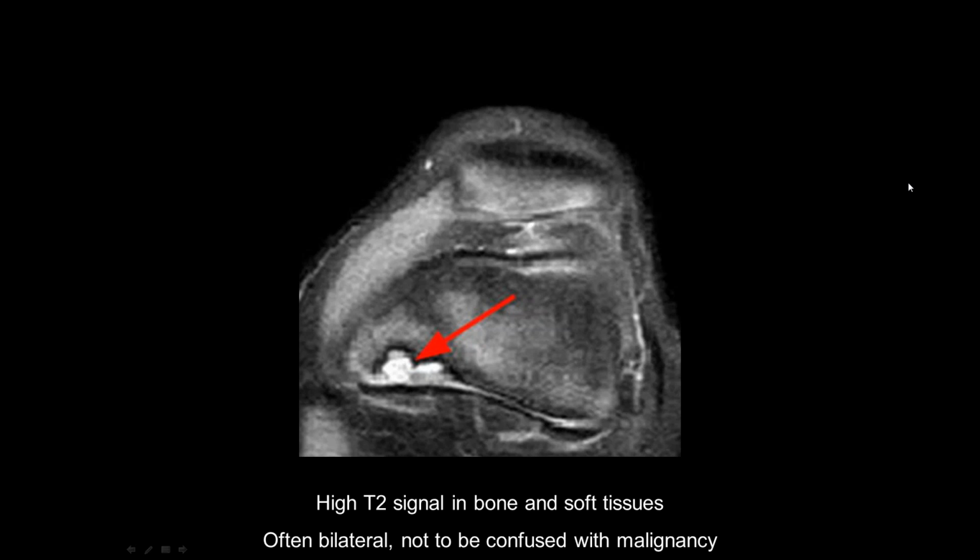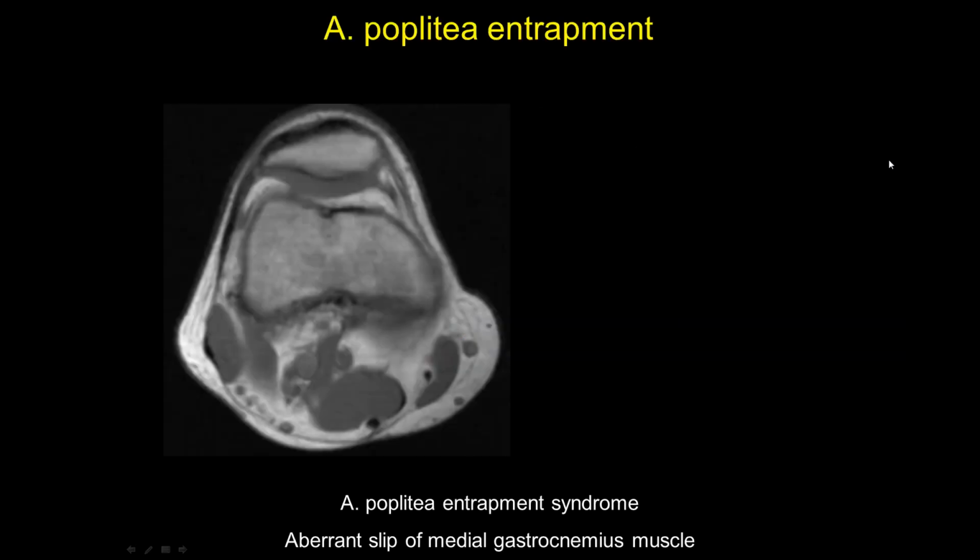And this is so often seen in children that you should not be afraid that there is some nasty process going on at that site, especially in young children aged 7 to 10 years old. So the last entity that I would like to show you, because I thought it was quite an interesting case, is the first case ever that I published, so many years ago.